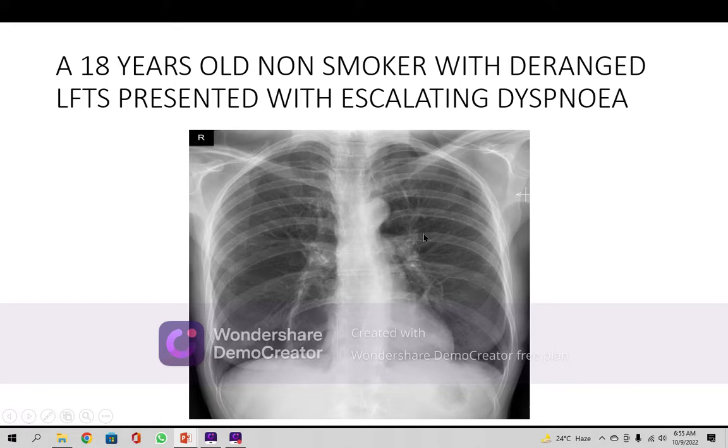And there are increased transparencies in the lungs, hypertransparency. She was a lady who had this type of problem. It is associated emphysema, severe, on both sides. Predominant emphysema is seen, as a part of COPD.